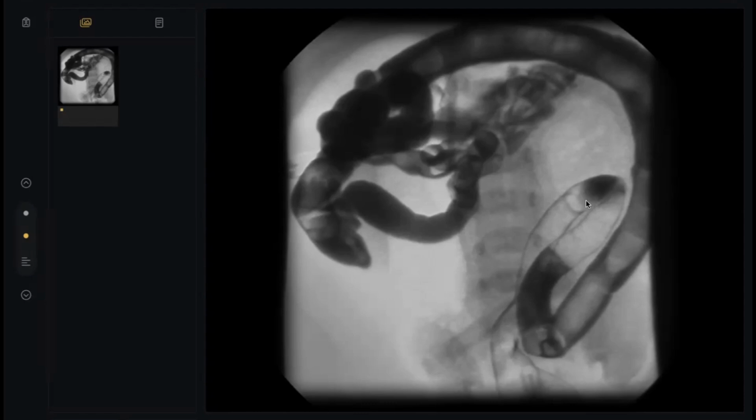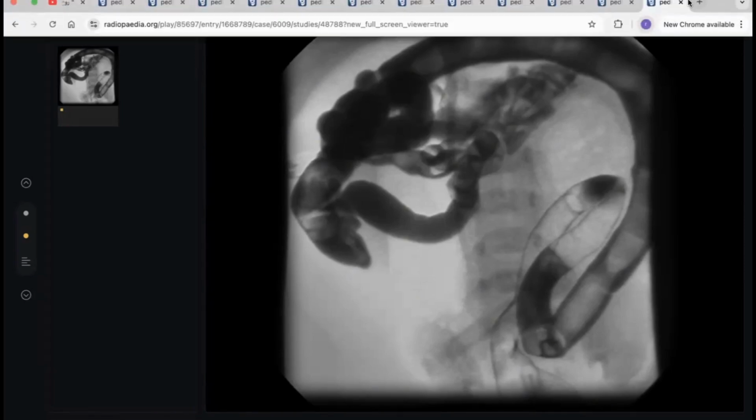So the only logical diagnosis here is a meconium plug. But usually in the exam, they will give you a very clear case. The clear case shows very small diameter of especially the descending colon and normal diameters of the transverse and ascending colon, filled with these plugs. Thank you, doctor, so much.